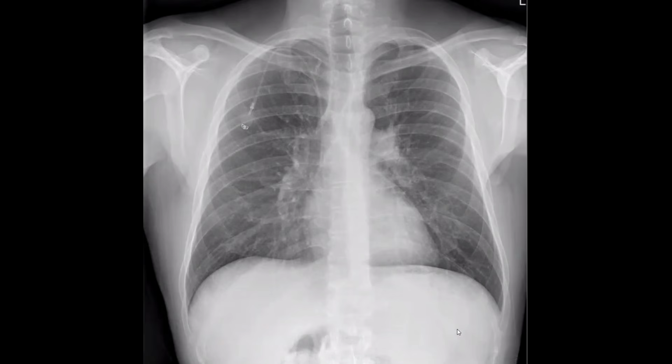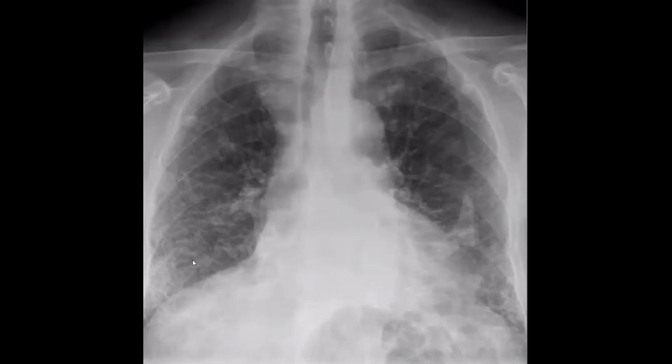Hilum is very important in our checklist. The left hilum, as you said, appears radiodense, as you can see here. The left hilum is radiodense as compared to the right side. Your differential, as you said, may be lymphadenopathy, maybe a hilar mass, and this one proved to be bronchial carcinoma. So please keep examining the hilar shadows. They should be symmetrical in density, should be bifurcating, and most of the time the left hilum is higher than the right hilum.